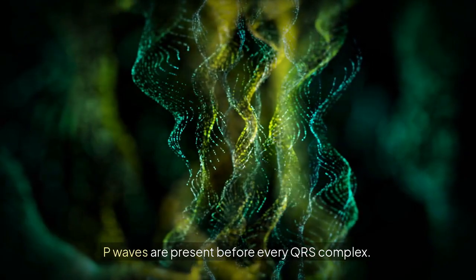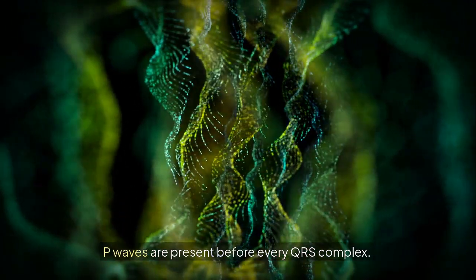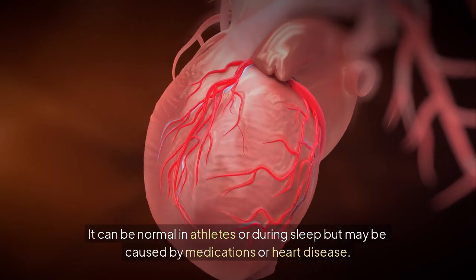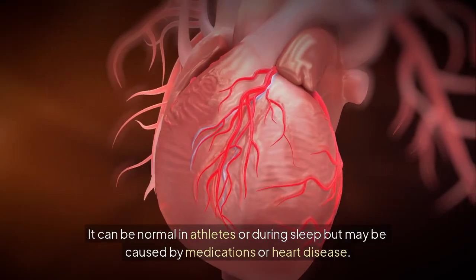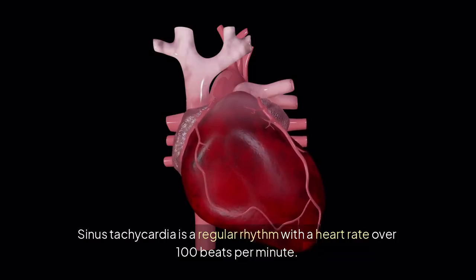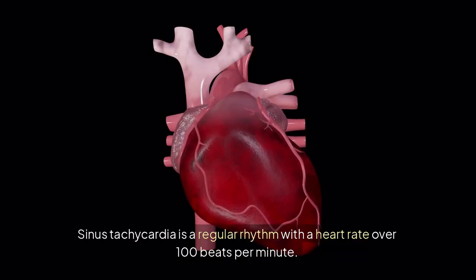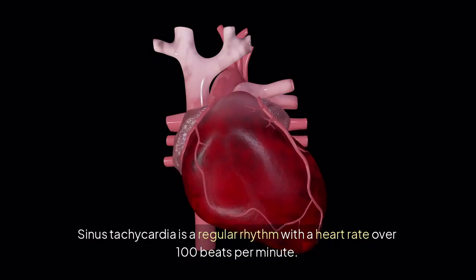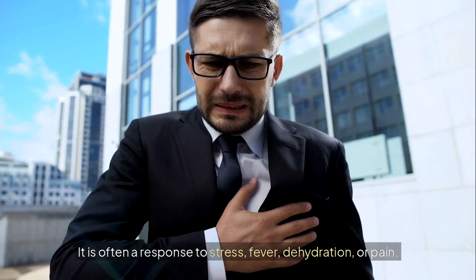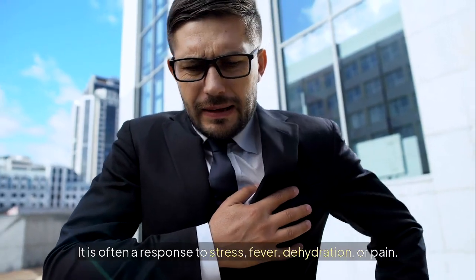P waves are present before every QRS complex. It can be normal in athletes or during sleep, but may be caused by medications or heart disease. Sinus tachycardia is a regular rhythm with a heart rate over 100 beats per minute. It is often a response to stress, fever, dehydration, or pain.